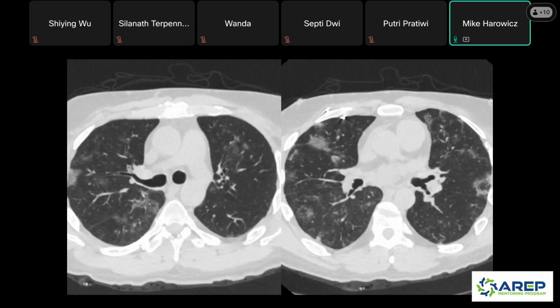So it's not just the fact that I'm seeing the atoll sign. You actually only see that in roughly 20 to 25% or so of cases of organizing pneumonia. But I'm seeing a lot of bilateral opacities and a lot of areas of sparing. If you look here, these opacities look what we call perilobular. Now it's kind of a misnomer, and I'll explain more about that.